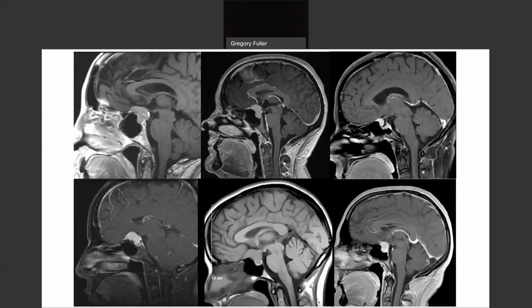And I'm going to give you a second here just to study each one of them. Have a look at those. Do you see how reproducible this picture is? These are 6 cases of the same entity. I mean, that's striking. Okay, for anyone who's, I don't know, we may have some medical students tuning in that still don't see the abnormality, this is what we're talking about. It is stunning how similar all of these look.